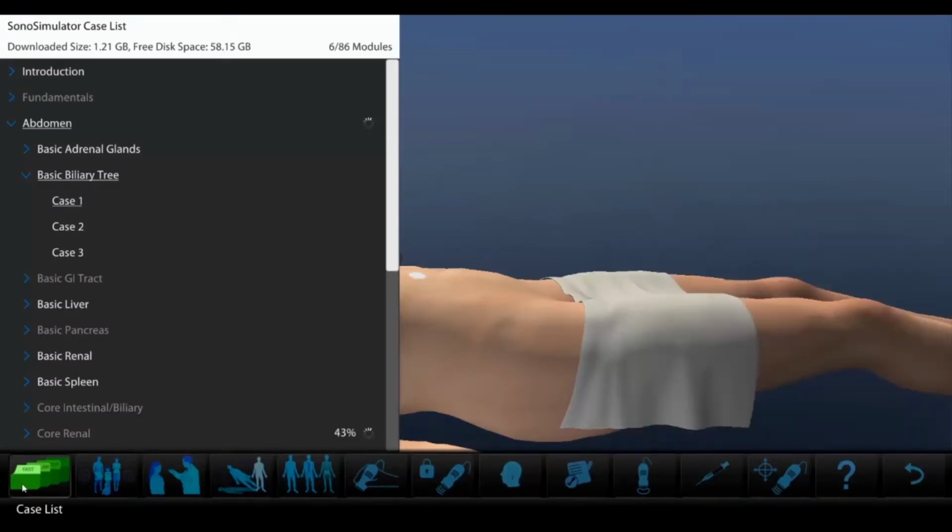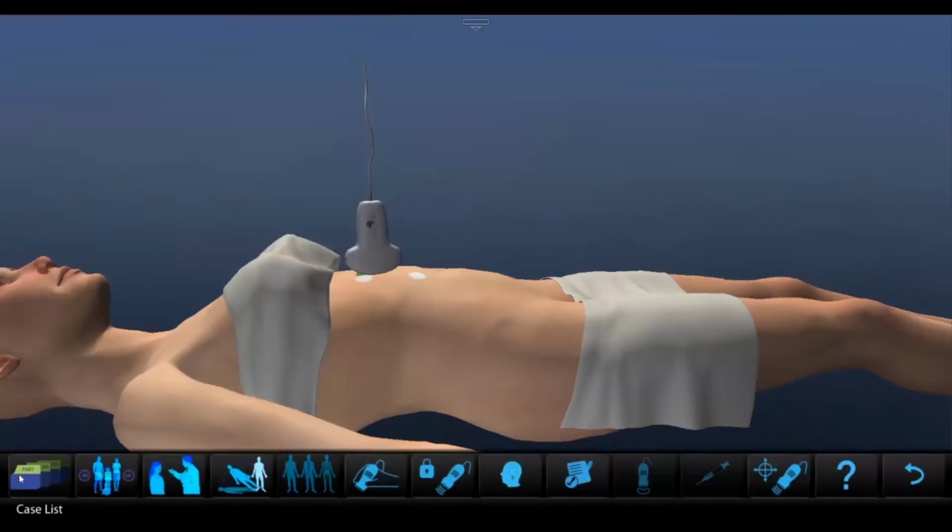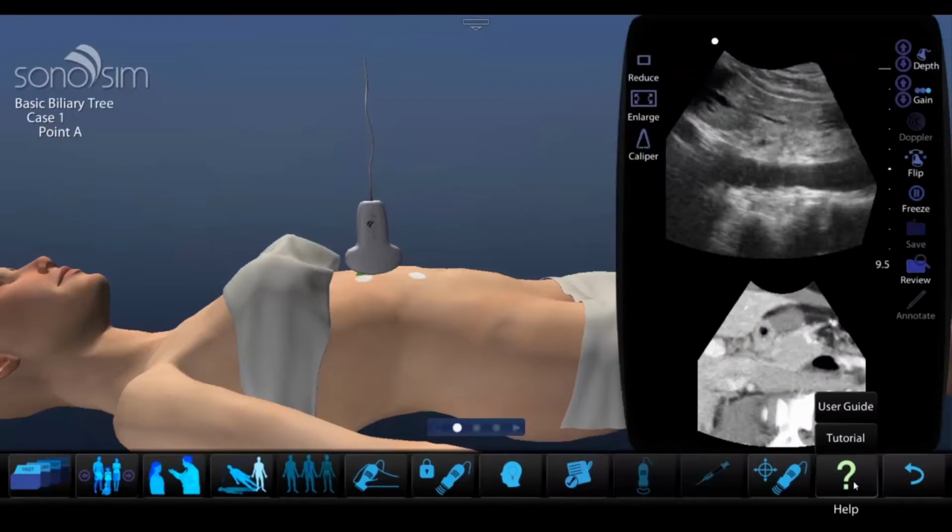That tutorial will pop up at the start whenever a new user logs in with their login credentials. It's also available at all times from the help menu.